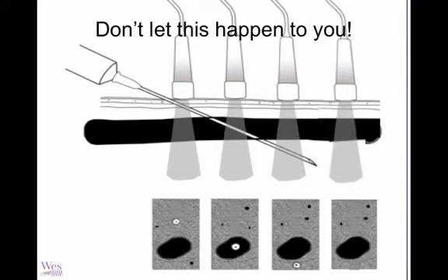Now, I'm going to prime you for something called the creep technique, which we'll come back to later, that is depicted here. And I want to allow you to think about the spatial and three-dimensional nature of ultrasound in the way that each ultrasound image here corresponds to the picture below, and how oddly each time the beam intersects with the metal, it looks the same, though the part of the needle that is being displayed is quite different. So that is the challenge of vascular access, and to do it at the highest possible level.